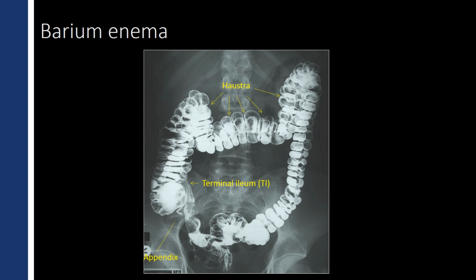Now, extending off the cecum, the tip of the cecum, as a blind-ended tubular structure is the appendix. Now, the Latin name is vermiform appendix. Vermiform means worm-like, and that's exactly what this looks like. This looks like a night crawler you could chop off and go fishing with.